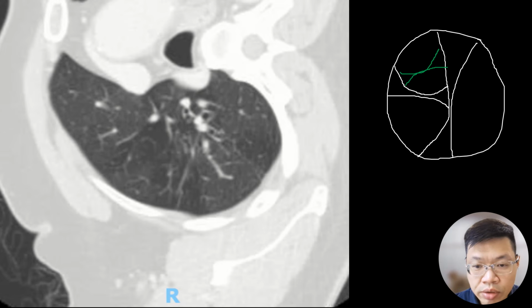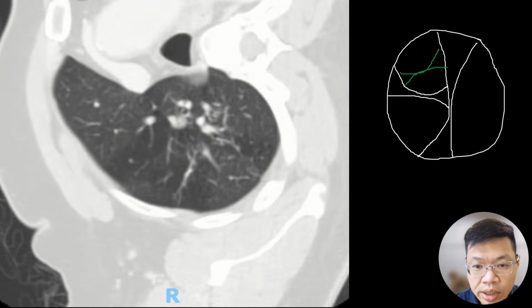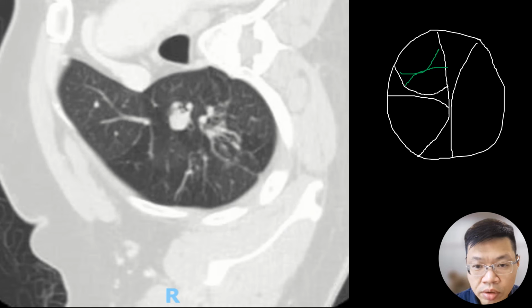Subsequently, as we continue to scroll on in the CT, taking care to look at it again, we can see that it is the hole on top, which very subtly further splits into a left and right hole over here, and we can draw the angles as such. And of course, the left hole, apologies, is the one which leads into the nodule.